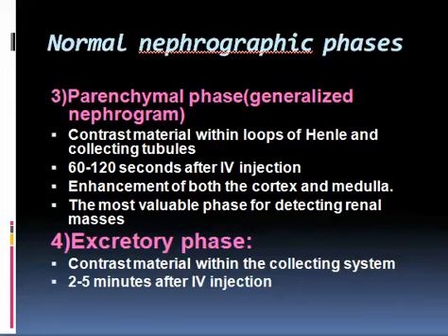Gradually this will fill the renal pelvis and go into the ureter. This depends on the amount of contrast given and the capability of your machine in conventional X-rays to get good contrast films. And in CT it is easy to detect any trace because CT is sensitive to the density of the metallic contrast.